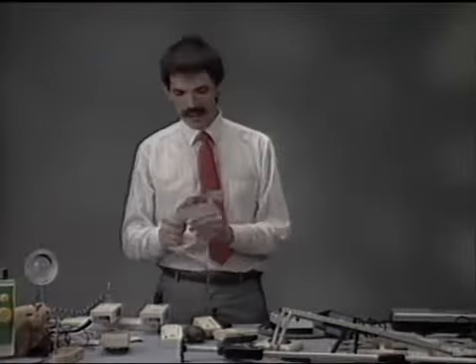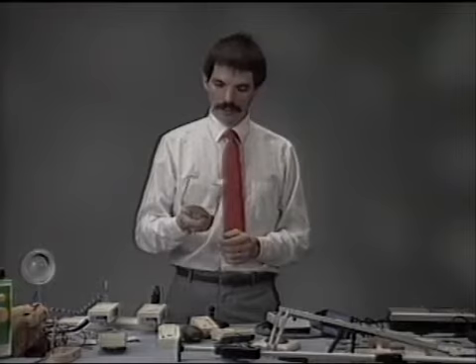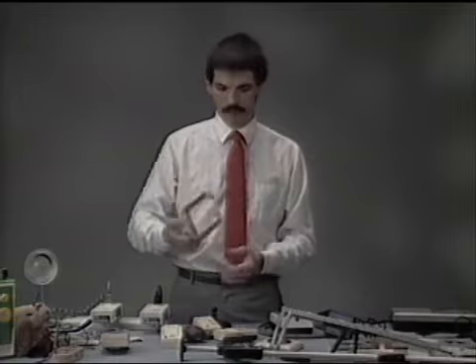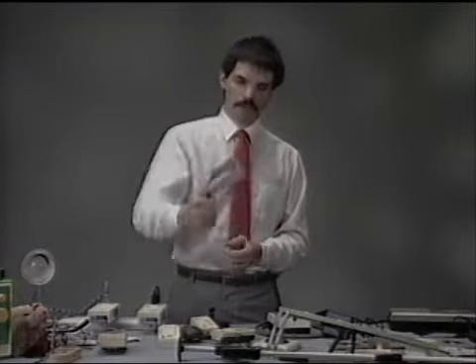Here's one, a great novelty item. Actually has a lot of great uses for people who are disabled and people who are non-disabled. This is designed to go on a half-gallon milk carton or an orange juice carton or any kind of box carton that you would pour liquids from and act as a handle. It gives you a nice way to grab onto that carton and pour out your milk there.